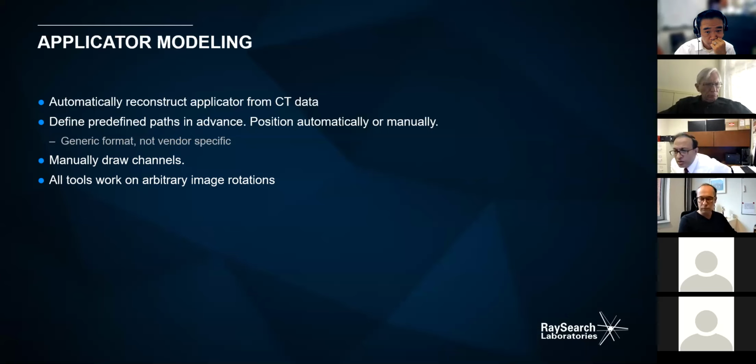Yeah, so we're looking into that, because I guess you mean also having the representation of the outer surface of the applicator. Yeah, the whole thing, because the vendors, either Elekta or Varian, can provide the model of the applicator. And a few key points, it will generate the whole thing inside out, everything. Yeah, that we are looking for, or we are currently using.